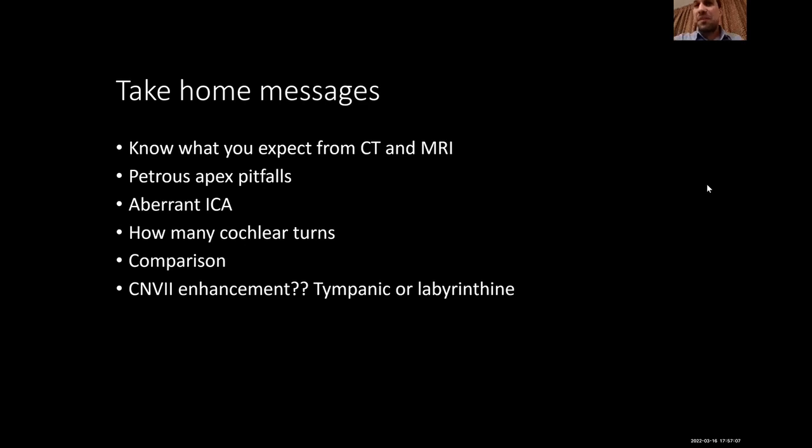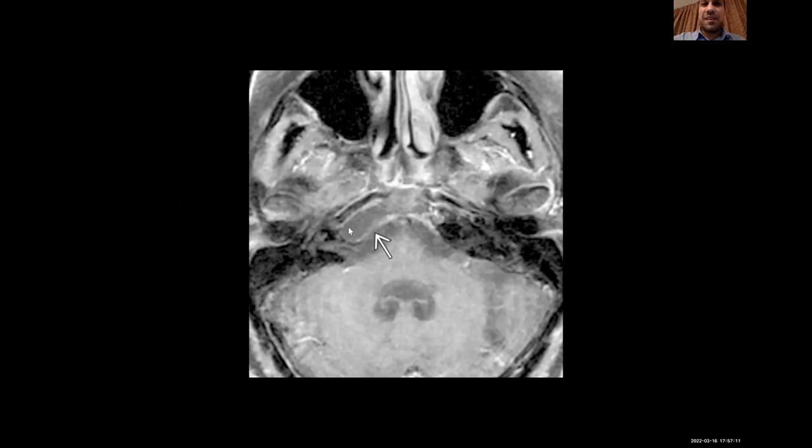Mohammad, not Ahmad. Yeah, Ahmad is the other. Okay. Here it is, the mucocele. No worries, no worries. Okay. Here it is. This is the mucocele.